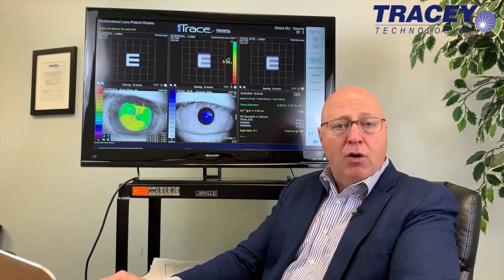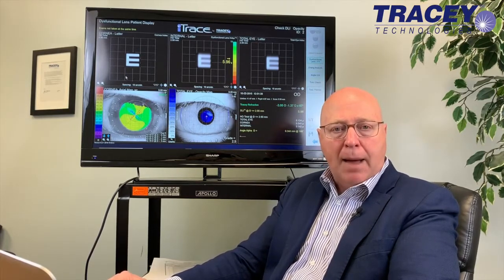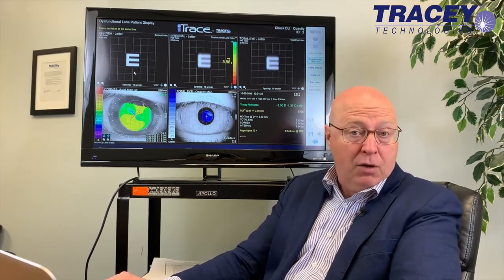A recent large study said that 5.7 or less on the DLI scale, and you should be able to take the lens out. So this is a borderline cataract. So how do you use this display other than understanding the DLI number? Well, first, you can look at the cornea qualitatively. This Snellen E represents the best optics the cornea can give. This is actually quite good.